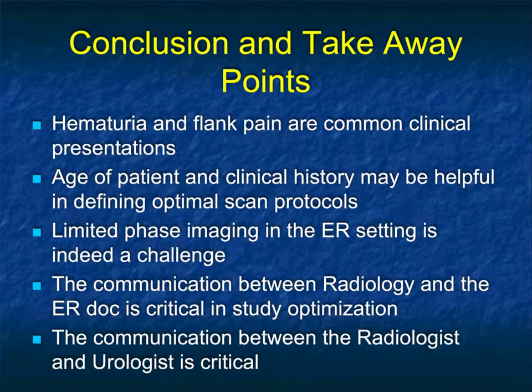So in the ER setting, please work with your referring docs to make sure they order IV contrast. Communication is critical. And for the radiologist, communication with the technologist, get the right protocol for the right problems. Don't do too many phases, but don't do too few phases. And I think I've shown you the range of causes of hematuria is extensive, but as a radiologist, using CT correctly, we can be very good at finding out what the cause of the hematuria is, what the extent is, and help with managing the patient.